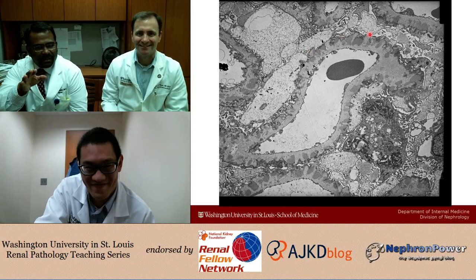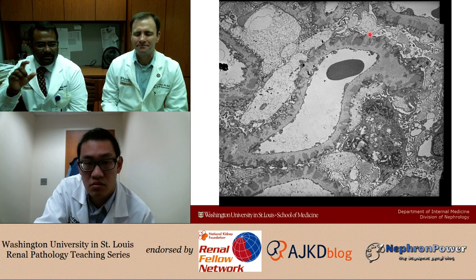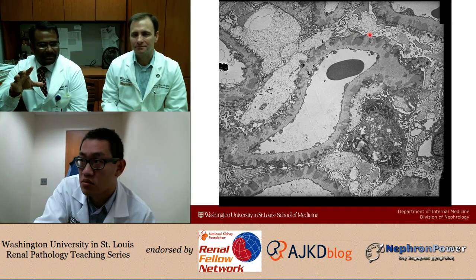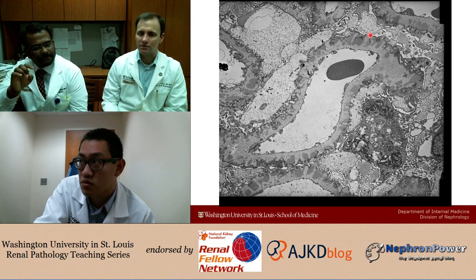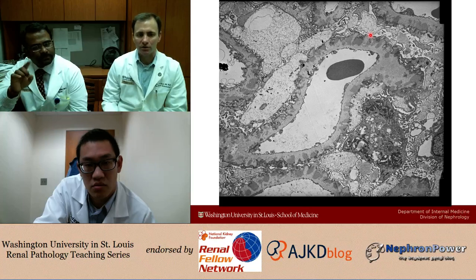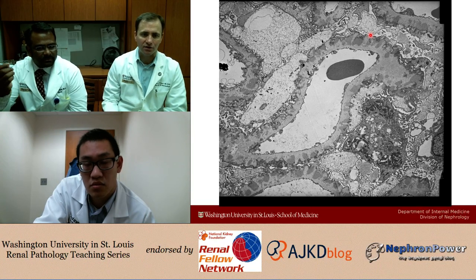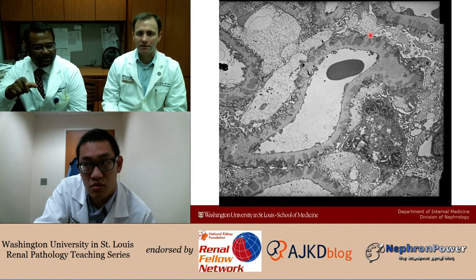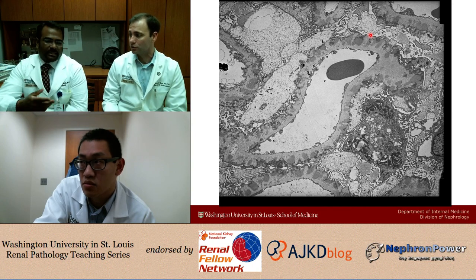And then, would you say if it's diffusely effaced versus just certain areas, would that correlate with idiopathic versus secondary? Or no, not really. No, our tools are limited to distinguish primary versus secondary membranous. Now, of course, if you have full house staining and the patient has a positive ANA and double-stranded DNA and all features of lupus, and if they have deposits in other locations, such as the mesangium and subendothelial deposits, then you're really thinking this is lupus.